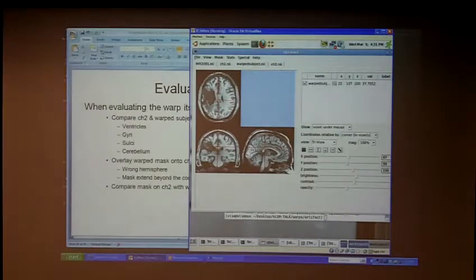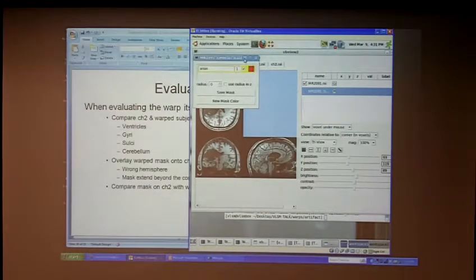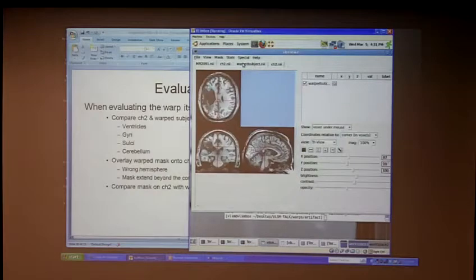I have to say that overall, from the distortion that you're talking about, I don't think we've seen that level of distortion as much. And I'm going to say that that's possibly due to the fact that we do go through the intermediate template. Did you use lesion mask here? Yes. Okay. So if we go back and actually click on the example you have here, it does show some of these strange little focal patterns, which I think are entirely due to the fact that our current intermediate template is not that good.